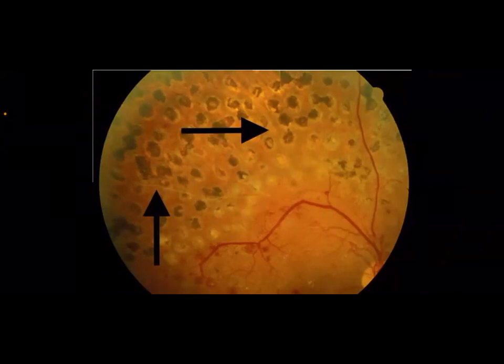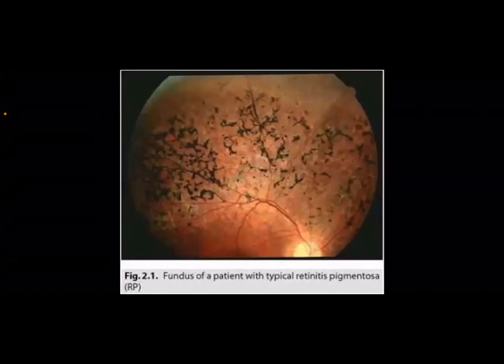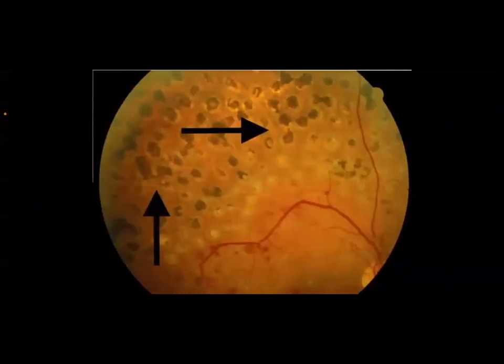Most of them are black, usually peripheral, and it is not well organized. These are well organized because someone put them there. Not like retinitis pigmentosa. So diabetic retinopathy finished, optic atrophy, papilledema finished.